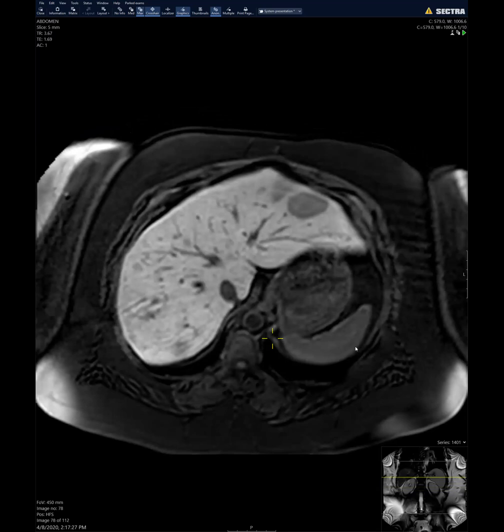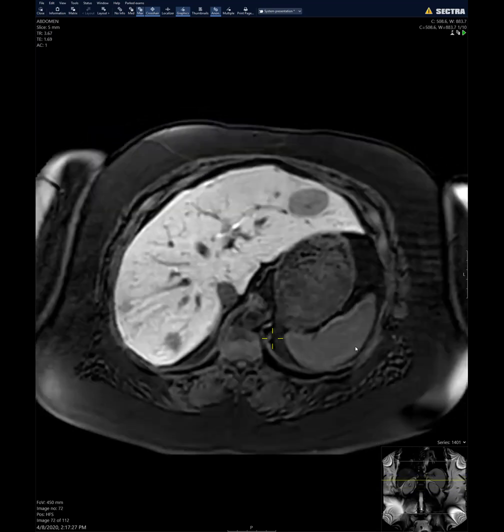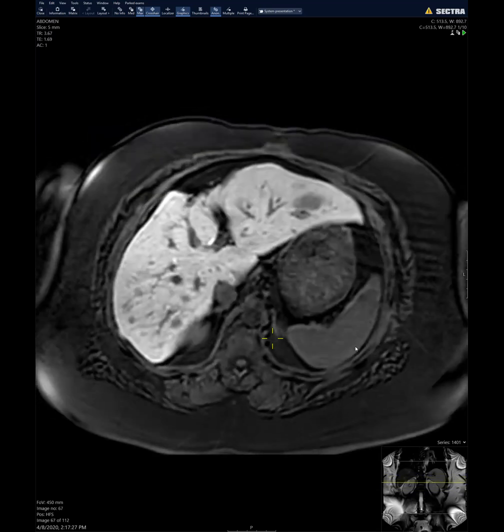So my theory was, if EOVIST really helps in differentiating the two conditions, if you see washout, these are adenomas. And if you don't see washout, it's uniform liver on 20-minute delayed images, it's just fatty liver with areas of fat sparing. I don't know if everybody agrees with that. I've not seen any papers talking about this.